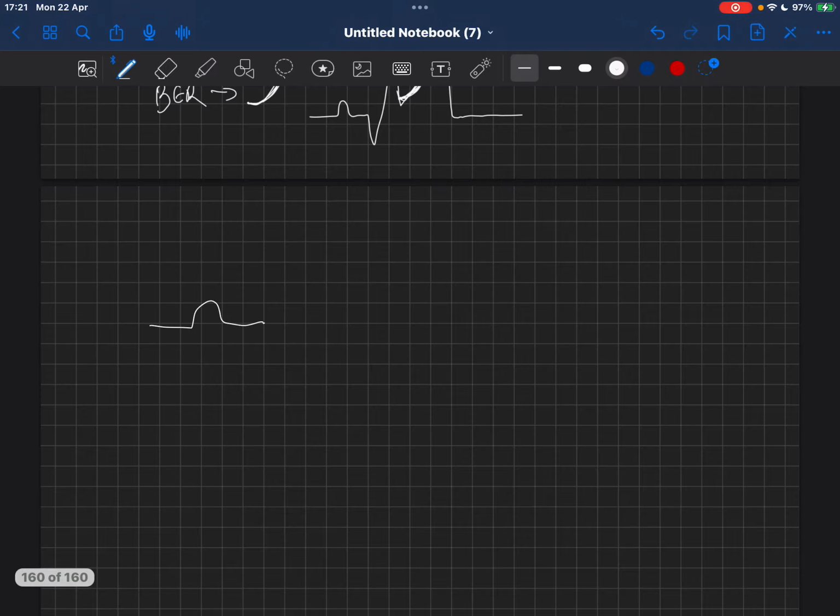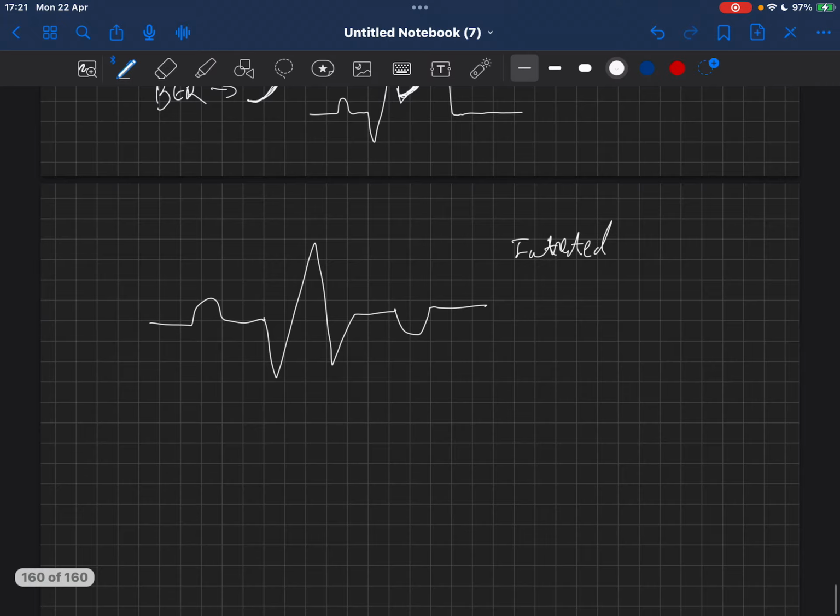There are some pathologies that can be seen in the T wave, like it can look like this, which is an inverted T wave. It can be seen in myocardial infarction, in pericarditis, in pulmonary embolism, and in hypertrophic obstructive cardiomyopathy. Many pathologies can invert the T wave, and it can even be normal in V1 and aVR leads, and in young children.